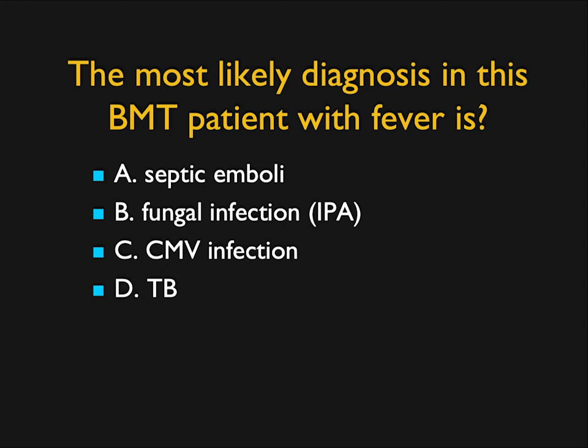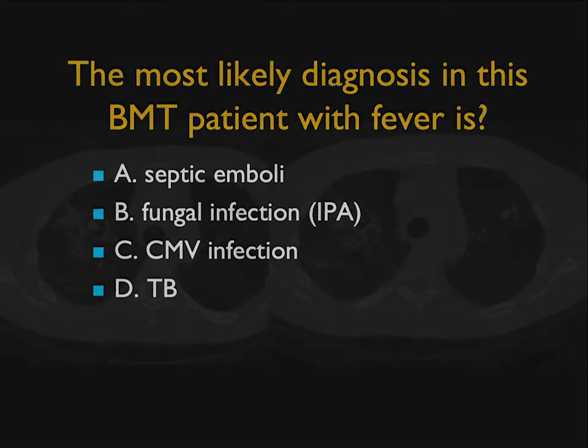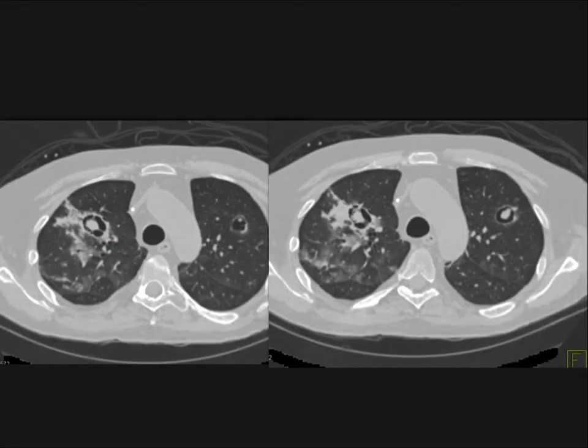This patient has a bone marrow transplant and has fever. When I see a BMT patient, you're always thinking about fungal infection. And what do you see here? Cavitary lesions bilaterally. You see some infiltrates. I'm always thinking about aspergillosis, invasive pulmonary aspergillosis.